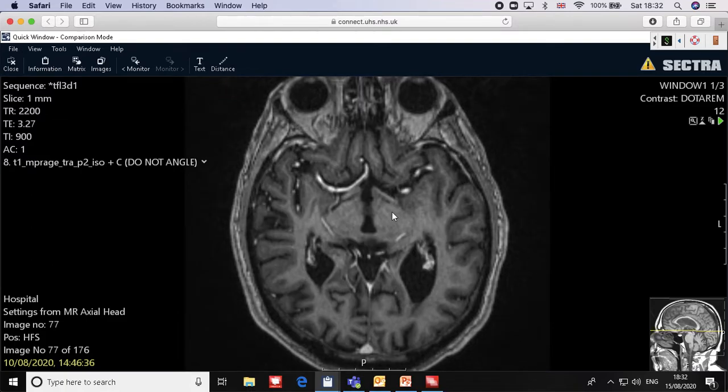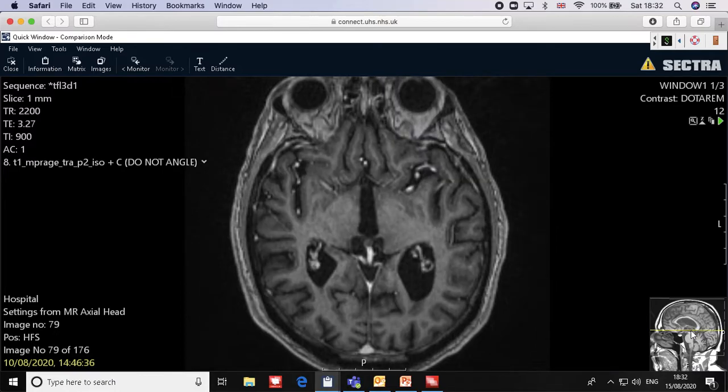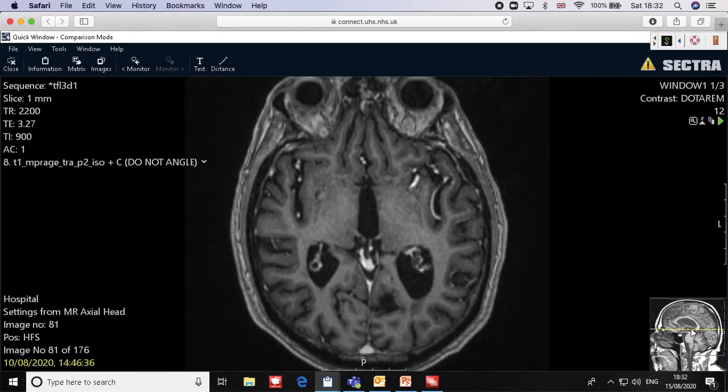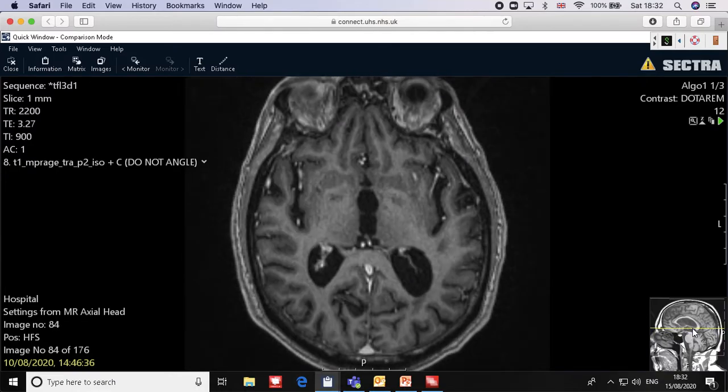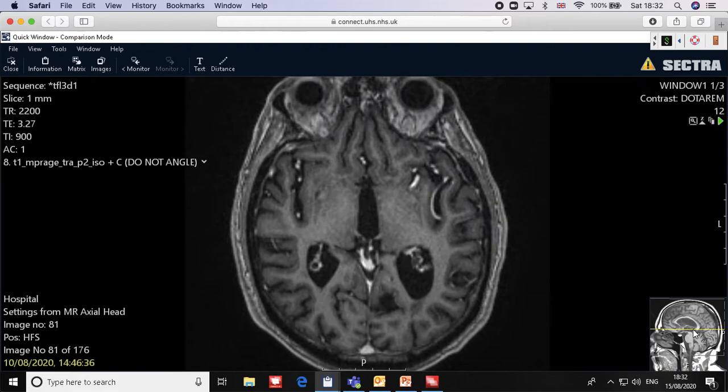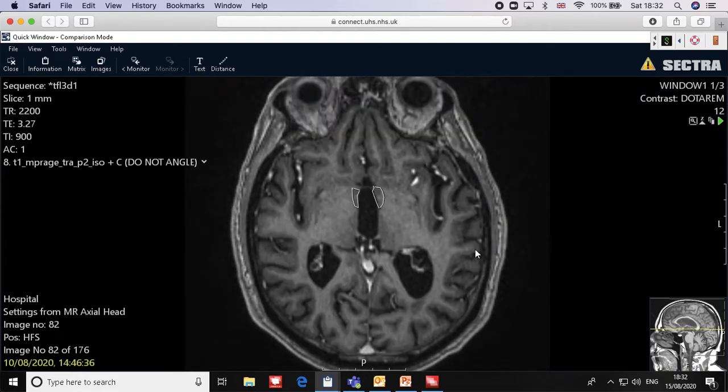So we have to delete that, by the way. Don't go slide by slide, but you can easily see it. Let's go up and see what's happening now. I was trying to draw it before. I will remove it for you. Okay. Let's delete.